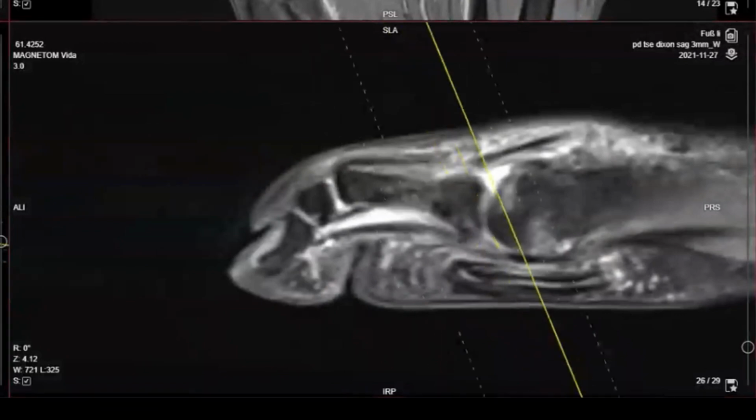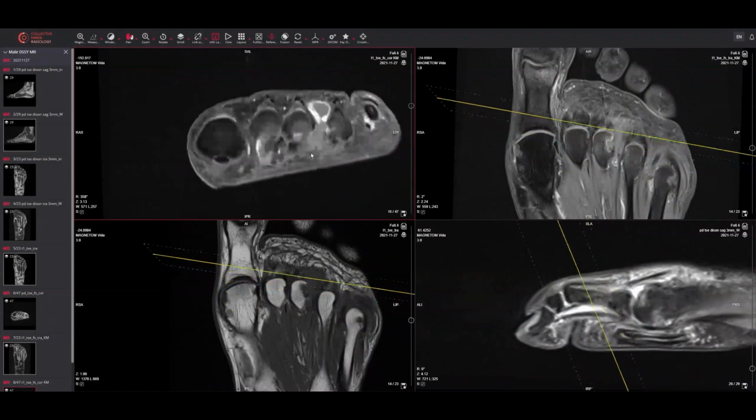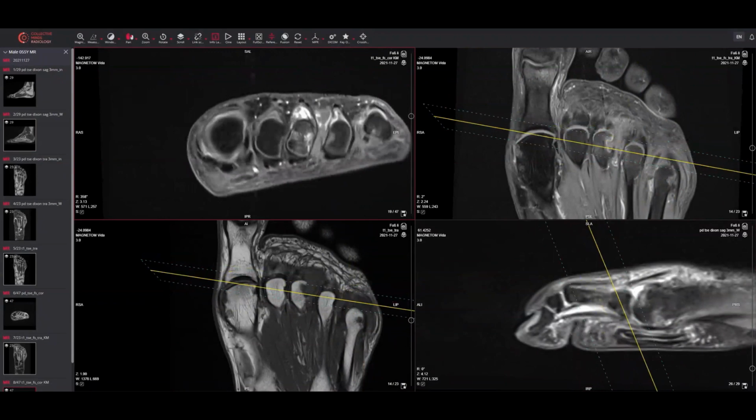So again, pseudoneuromas versus neuromas, the important distinction is twofold: eccentric pericapsular fibrosis, now recognized as an important and useful correlate. It can be more readily apparent than a small defect in the plantar plate itself, so we're going to pay close attention to any pericapsular capsulitis or synovitis so that we can avoid misdiagnosing those as neuromas.